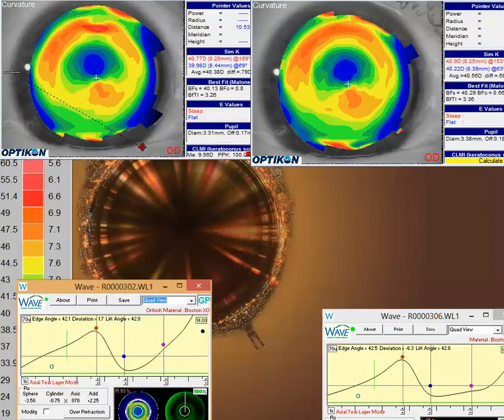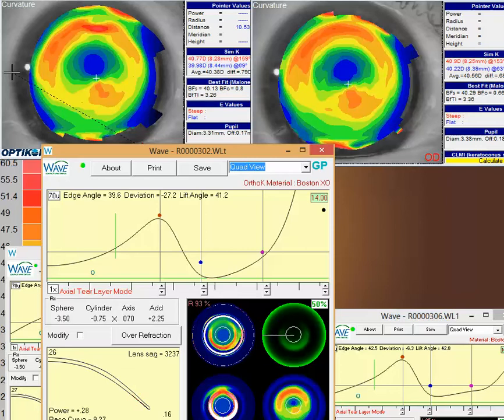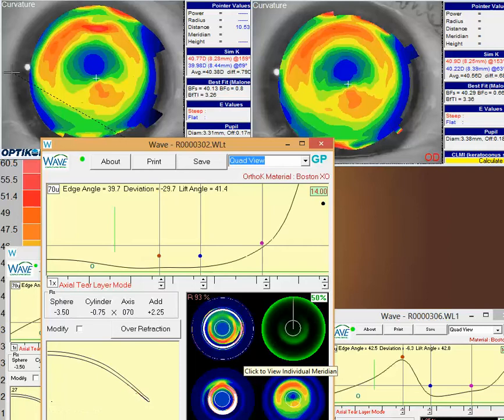So I did mock up a little bit of a design here, and I take it you saw the Wave training video that has the 8-step approach for fitting these mini-scleral lenses. If not, I'll also attach that in the email that I send over with this. But I went back through and took your same basic design and just switched it over to a freeform modality. And I just went around and redesigned the lens to see if we can get it lining up a little better in those different meridians.